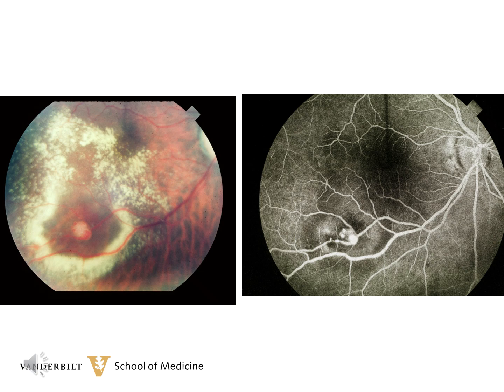This patient does not have neovascularization, but there is an abnormal retinal blood vessel, and this is a macroaneurysm. You can see this quite easily along the infratemporal arcade on the clinical photograph, and it's already beginning to fibrose. However, it is leaking a tremendous amount of serum, and you can see this by the very, very prominent circinate pattern around the macroaneurysm. On the fluorescein angiogram, you can see the dilated macroaneurysm quite well, and there's some hyperfluorescence there and a slight amount of hyperfluorescence from the leakage.